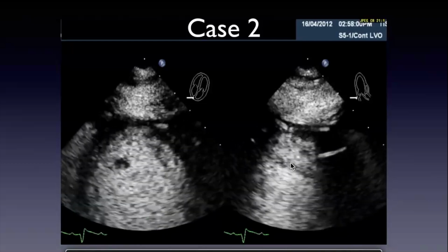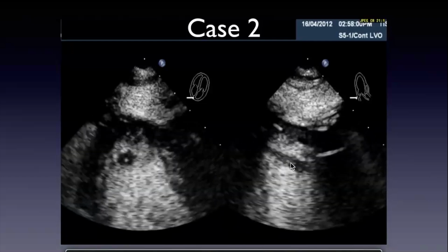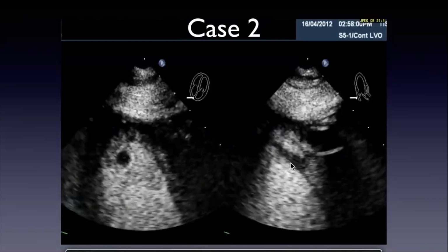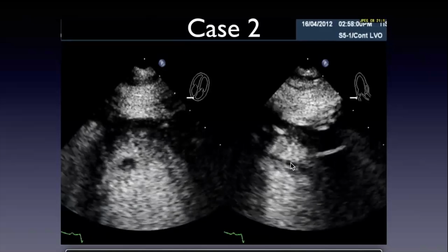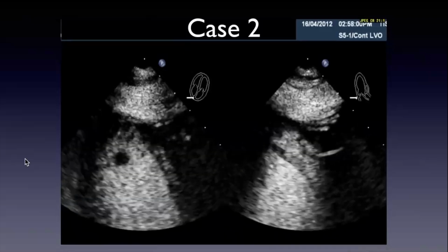If there's a thrombus identified, the patient goes on anticoagulation and has follow-up, etc. So it's something useful to distinguish. Was it confirmed on CT or MRI? No. Or other modalities? No. But this is good enough. I think this is good enough.